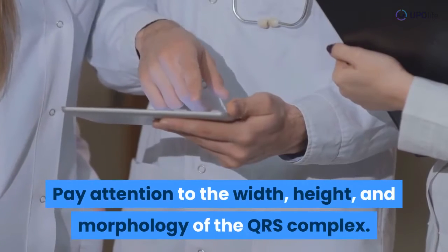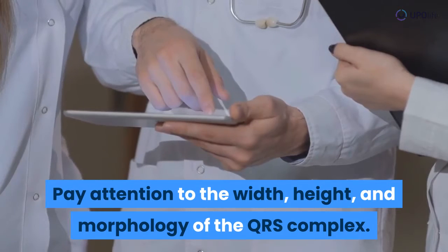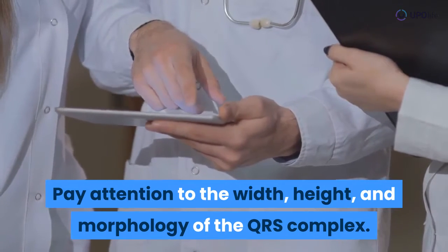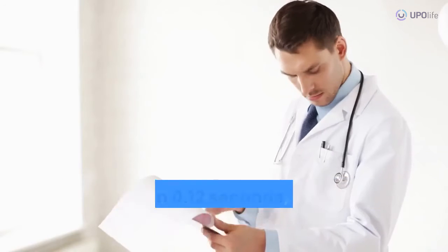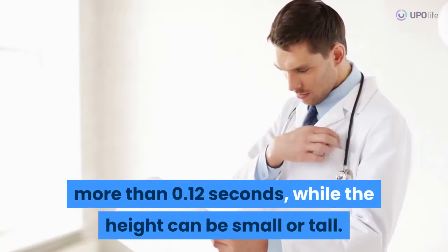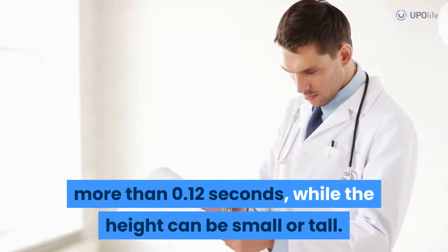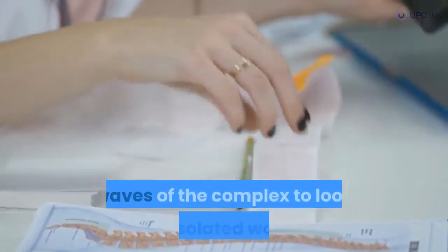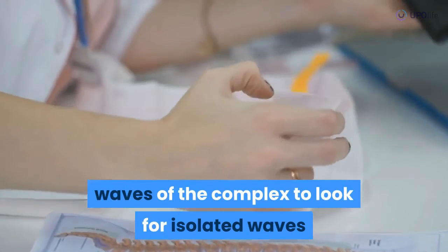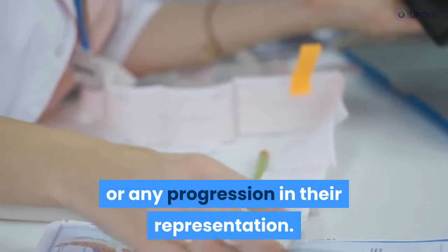Pay attention to the width, height, and morphology of the QRS complex. The width can be narrow, less than 0.12 seconds, or broad, more than 0.12 seconds, while the height can be small or tall. Morphology is assessed by focusing on individual waves of the complex to look for isolated waves or any progression in their representation.